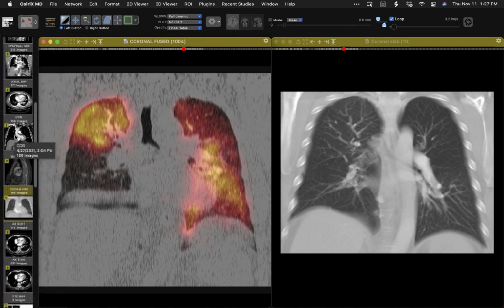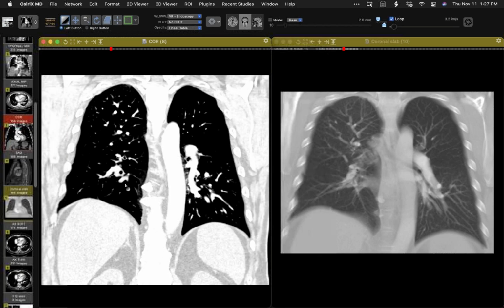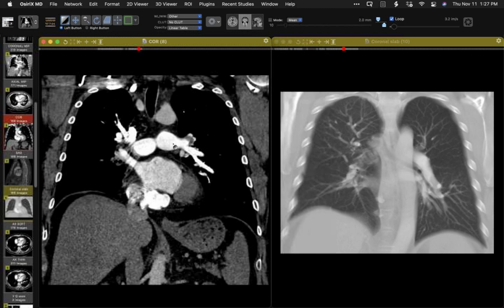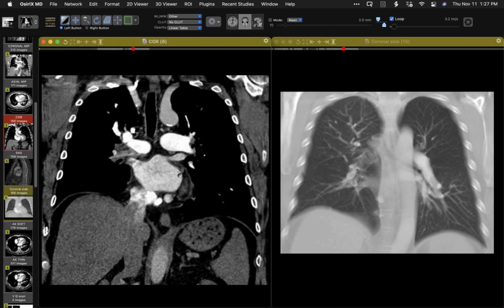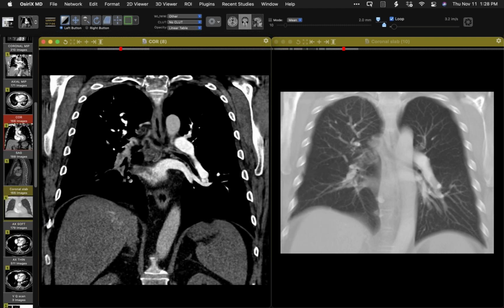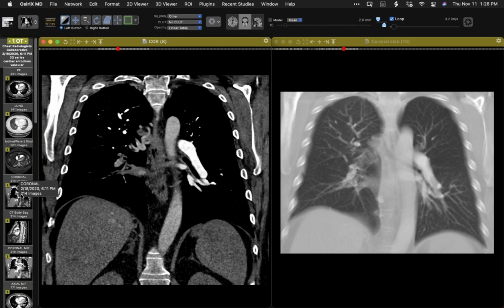And now, of course, I'm going to show you the counterpart for what we see here, which is really no artery going to the upper lobe right there. And look at the extent of abnormality down here, where we have substantial abnormality that goes along with what we see there. And then we have the bronchial arteries. So a dramatic case of CTEPH that you see there.